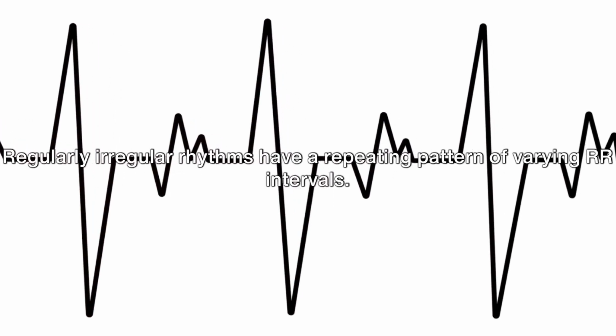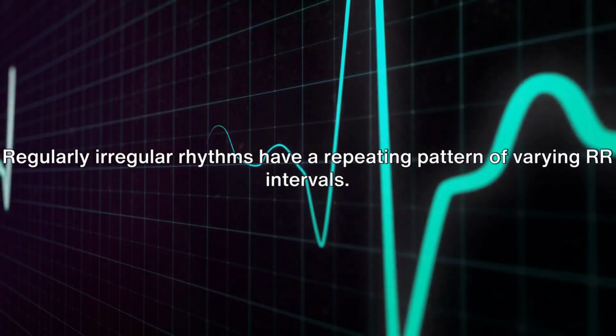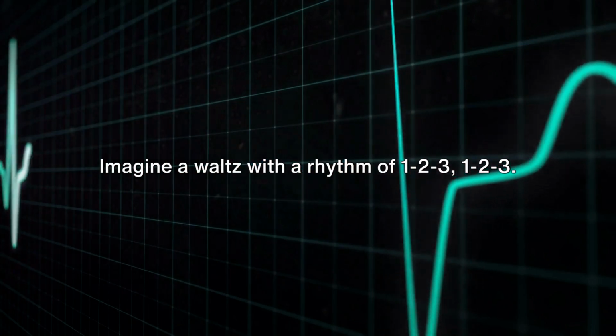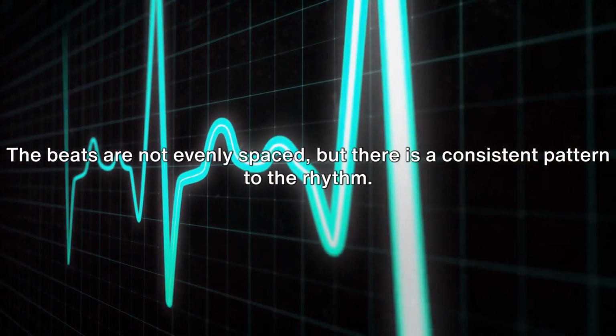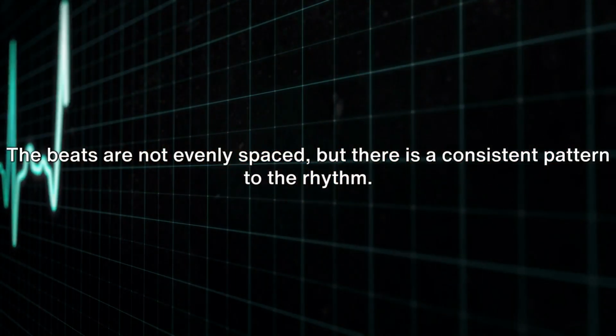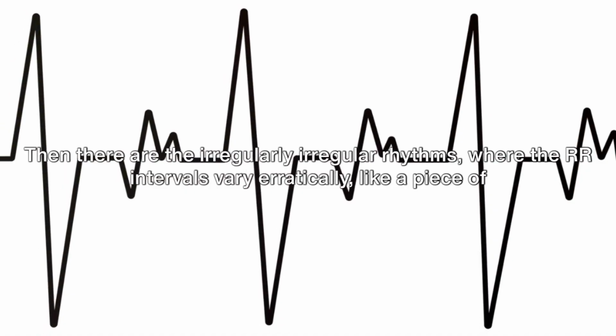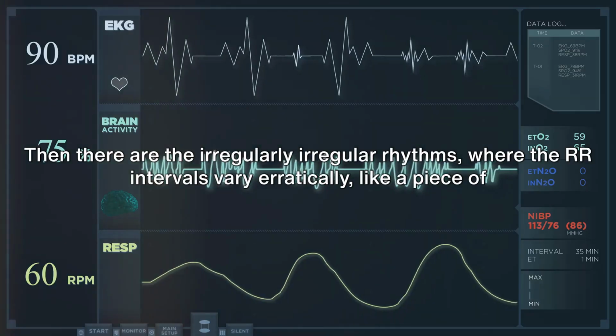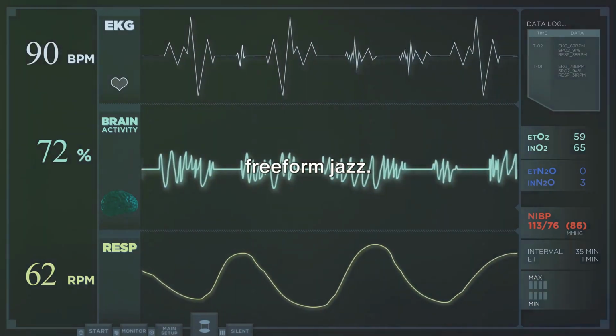Regularly irregular rhythms have a repeating pattern of varying RR intervals. Imagine a waltz with a rhythm of 1-2-3, 1-2-3. The beats are not evenly spaced, but there is a consistent pattern to the rhythm. Then there are the irregularly irregular rhythms where the RR intervals vary erratically, like a piece of freeform jazz.